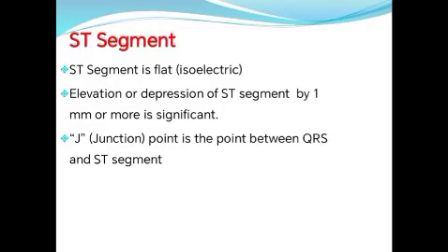Okay, we are continuing our lecture about the basics of the ECG. We are going to talk now about the ST segment. The ST segment is flat, that means it is at the isoelectric line. That is a normal ST.